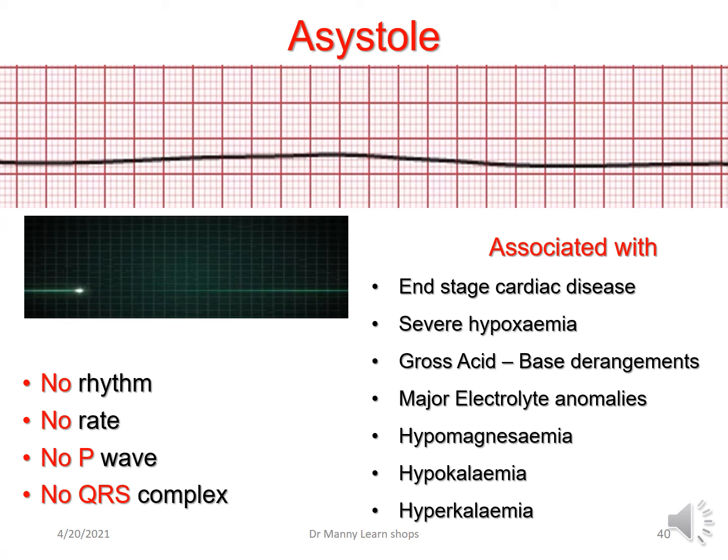Asystole, there's no electrical activity, there's nothing to convert. So by shocking the patient's heart, you actually make things worse. Asystole, no rhythm, no rate, no P-wave, no QRS complex, no electrical activity. That's what A means. A means, in Latin, nothing. No systole, which means no cardiac output.